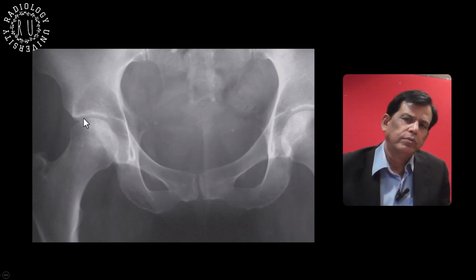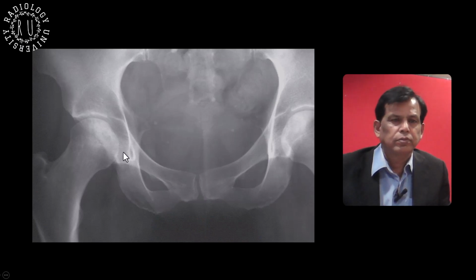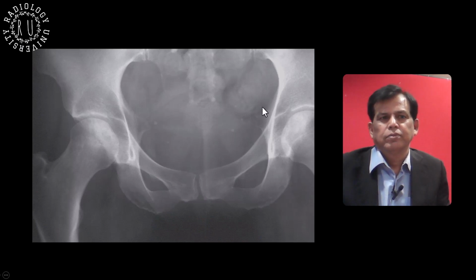However, the outer contour of the femoral head is well maintained with normal joint space of the hip bilaterally. I cannot see any definite fracture line, and the rest of the bones appear normal. I'm trying to outline the sacrum and it appears normal. Apart from a few phleboliths, I do not see any abnormality in the pelvis. This could be some bowel gas.